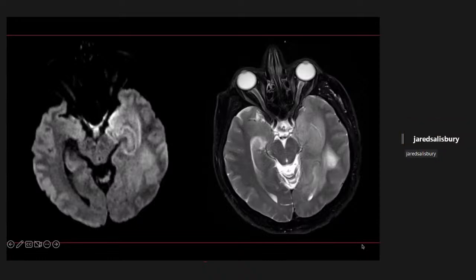Yeah, let's see here. Those are the FLAIR images. The fact that I see very little other structures outside of the brain parenchyma, and the fact that it looks like a crappy FLAIR sequence, tells me it's probably the diffusion weighted images. Right. Okay. Yes, and what do you think the second one is here, given the bright CSF? Right, the bright CSF, I think that is a T2. Okay. All right. What are you seeing?